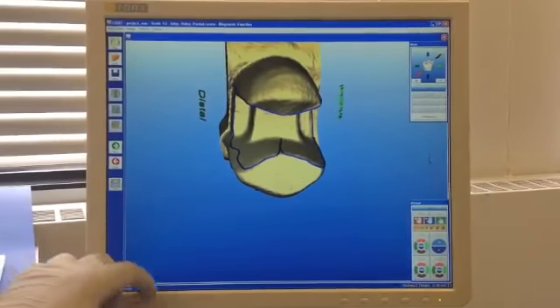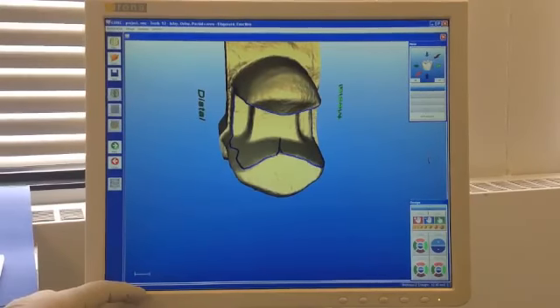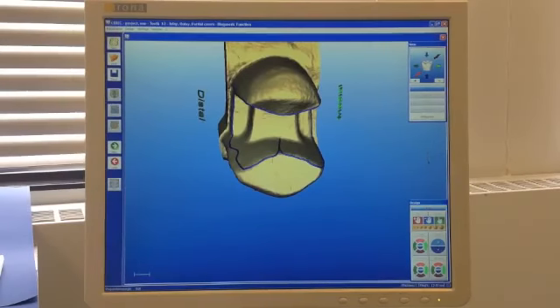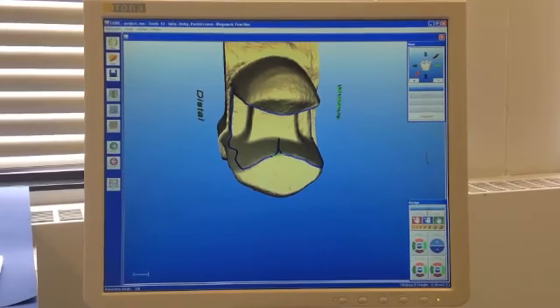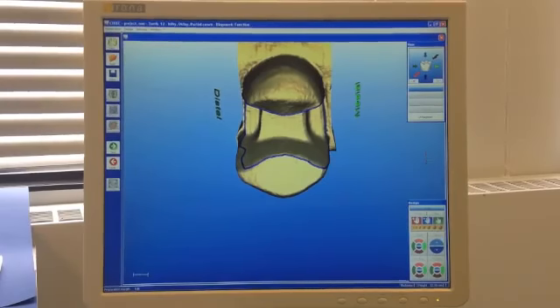The software can also give you a second step to edit this margin. Once you see an area like that, you bring your mouse to this particular spot right here, double left click. You can see that I have the green line back there. Connect to the other area, double left click again. And now I just fixed the previous problem.